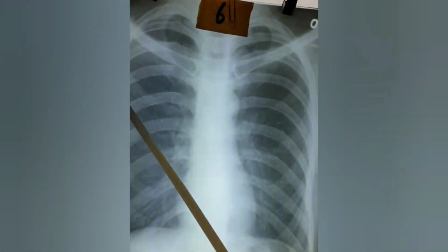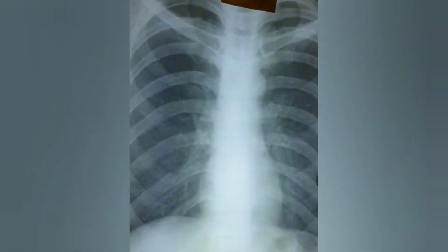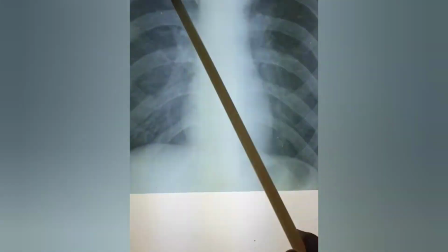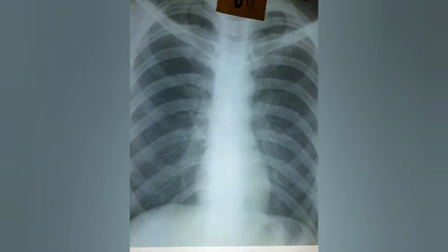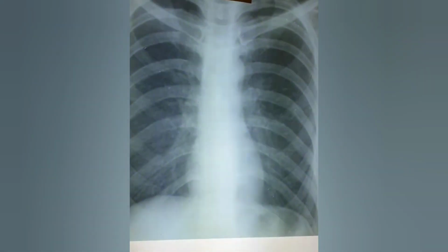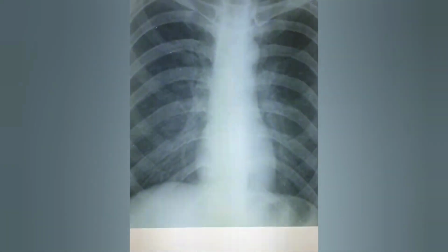So, how do we discuss this? Upper zone, mid zone, and this is the lower zone. The X-ray report will describe how the lungs look in the upper zone, mid zone, and lower zone. So once we start chest X-ray reading, we say the view is chest X-ray PA view, and the skeletal structures, clavicle, ribs, look normal.